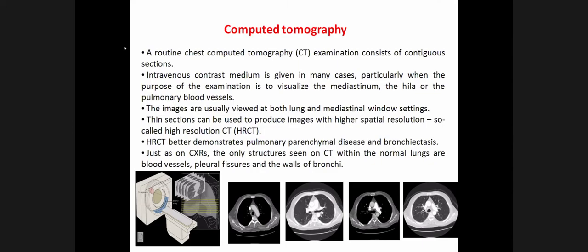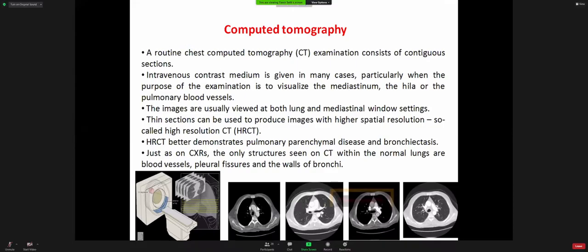CT. In CT you have to know this is a CT from the start. But the modality is also CT. All these are CT images. Right? Then you have to know what this is called. CT what? CT scan of the thorax, mediastinal window, I believe. Yes, excellent. Mediastinal window. And this one? The lung parenchymal window. The CT scan.